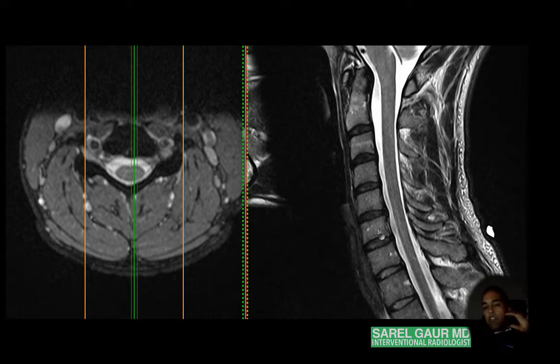So start with the curvature, then move into signal, looking at the vertebral bodies, looking at the signal of the vertebral bodies, looking to see if there's infiltration. Marrow infiltration is typical of mets, though other processes can cause it, but it's just something I'll be looking for. It should be fatty and bright on the inside here. So if that signal is gone, that's a good indication of maybe infiltration. That could be metastases, it could be infection, it could be a few other things, but those are some things I'm looking for.